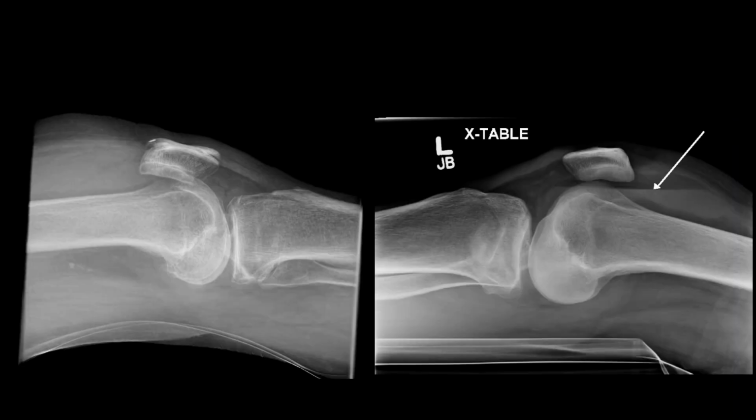Moving on, one thing to point out is that we have two different x-rays here showing two slightly different things. So pause them, look at both, and we'll review it. So hopefully you'll have had a look, and we can see over here, when we look at the suprapatellar bursa, we can see a density over here, and this is the appearance of an effusion in the suprapatellar bursa. On the x-ray that we have on the right, we see quite a straight line, which the arrow has quite helpfully pointed out over here. And this is a fluid line, and this is what you would get in a lipohemarthrosis.